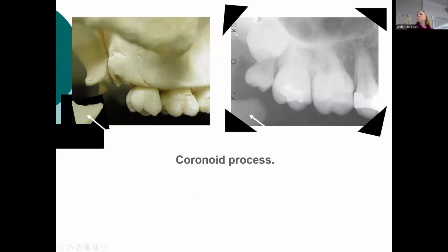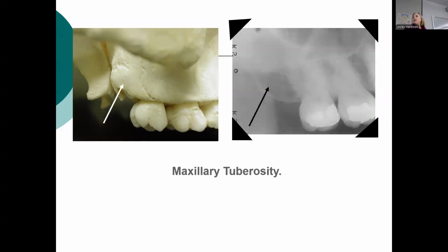Why does the maxillary tuberosity not look as solid on both? Like on the picture, it's like 28. Normally it doesn't look like that. I think it really depends on the way the x-ray was taken. It's definitely solid bone, but I do think sometimes the trabeculation doesn't show up as well. Maybe they did have an extraction at some point and the bone hasn't filled in as heartily. I don't know.